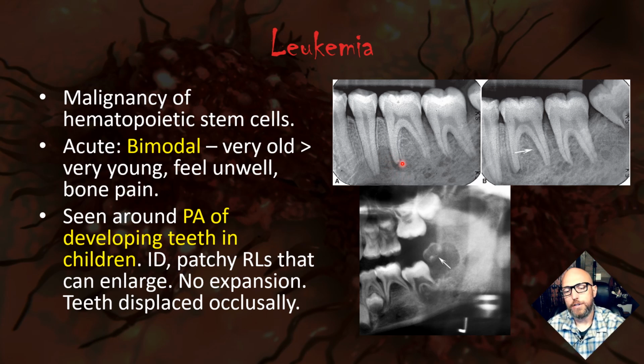Maybe if your eyes are just isolated on that one spot and you don't look at the rest of the image, but something's going on around here. Something is widening here. I compared this in that previous radiograph of lymphoma, that expanding marrow space. That's a strong sign of a hematopoietic malignancy. And so lymphoma or leukemia is another one.